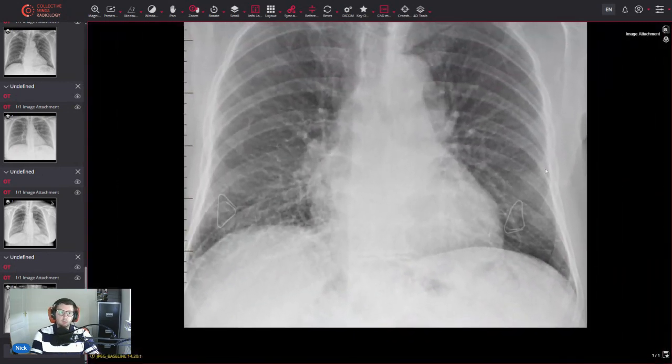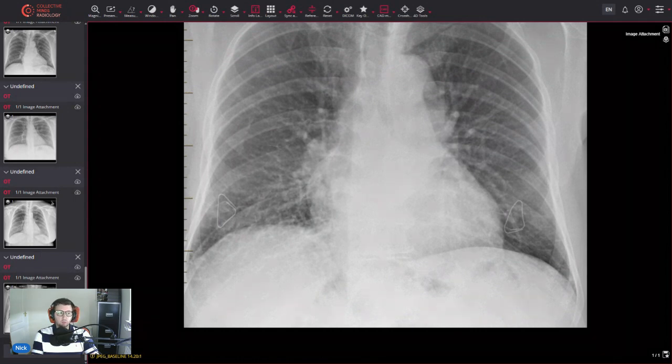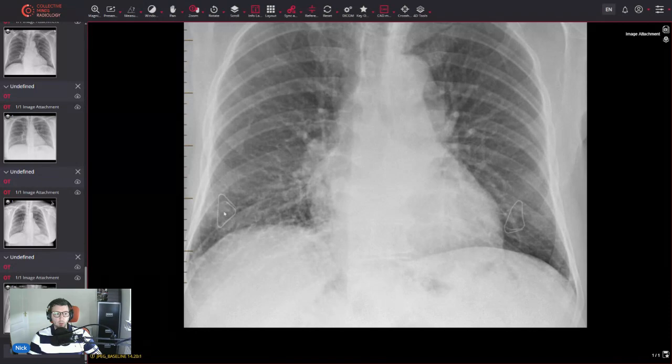If there's any doubt, very occasionally I have seen nodules which are just unfortunately positioned and end up over a marker. So they've actually had a repeat x-ray with a nipple marker, and it has fallen in this area within the marker but turned out to be a nodule still.